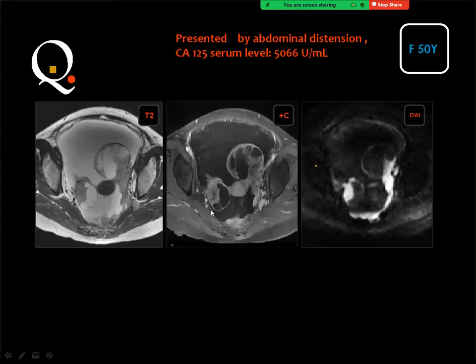And you got two ovarian masses actually, and these ovarian masses are partly cystic and partly solid. Also on the right side, you got a cystic and solid component. This is definitely malignant. And as you know, serous cystadenocarcinoma is more likely to be bilateral compared to the mucinous cystadenocarcinoma, and the incidence of serous is maybe 10 times more common than the mucinous cystadenocarcinoma.